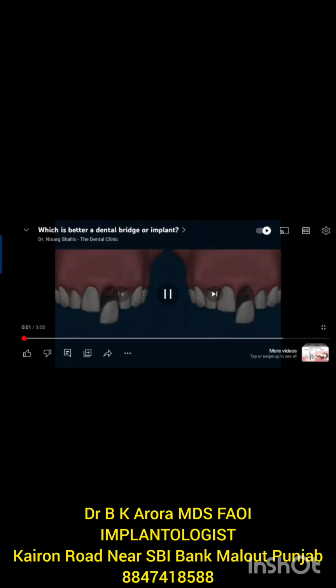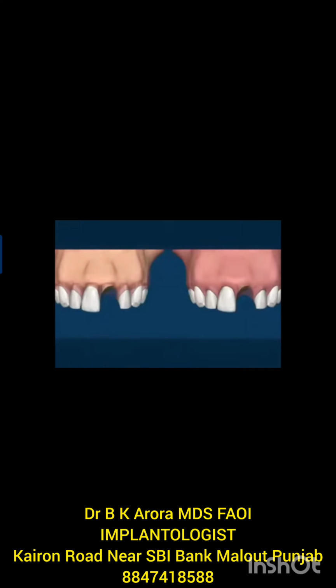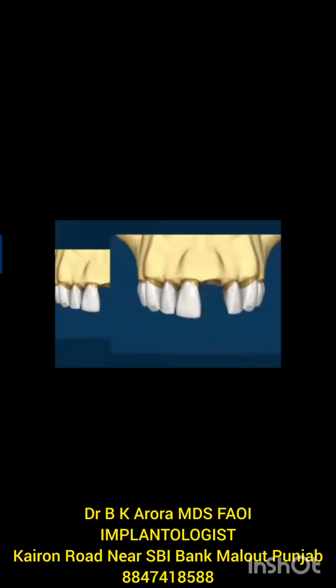This animation shows two identical situations being treated in two different ways. The loss of the central incisor.